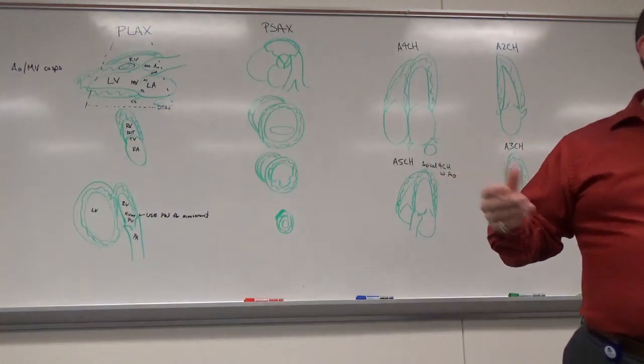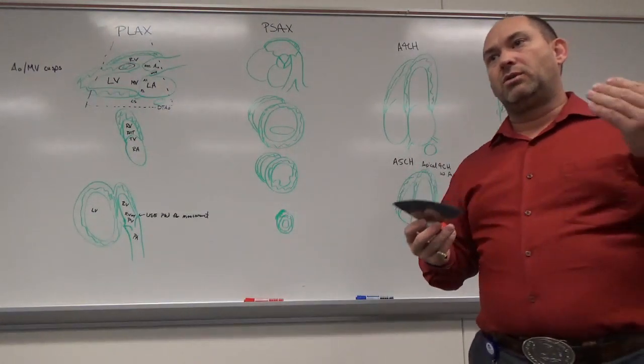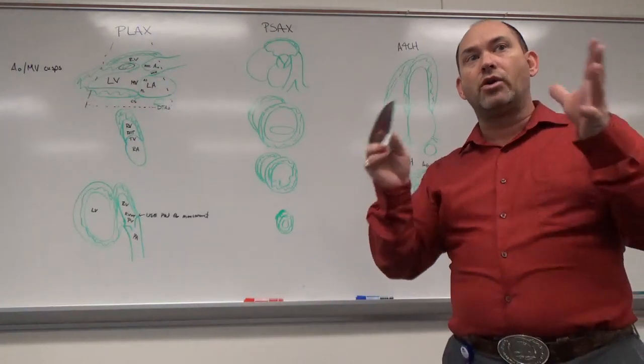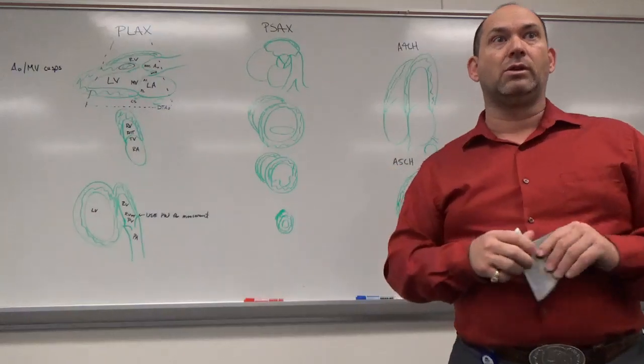They tell me what your maps are. They tell me what your dynamic range is. They tell me if you have harmonics on. They tell me if you got compounding on. I can tell all that information based on what's on the picture.